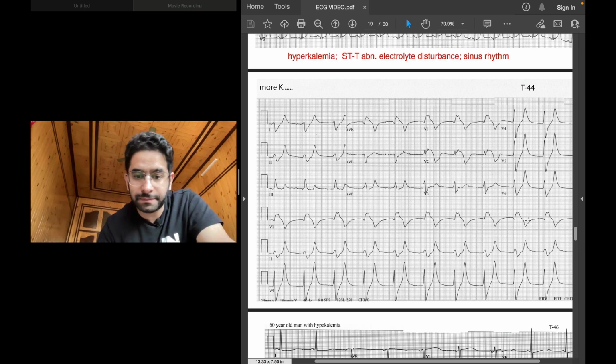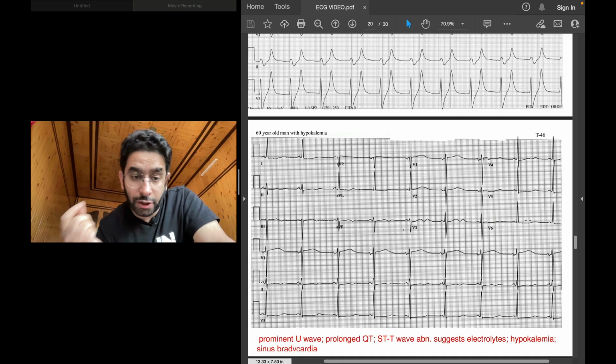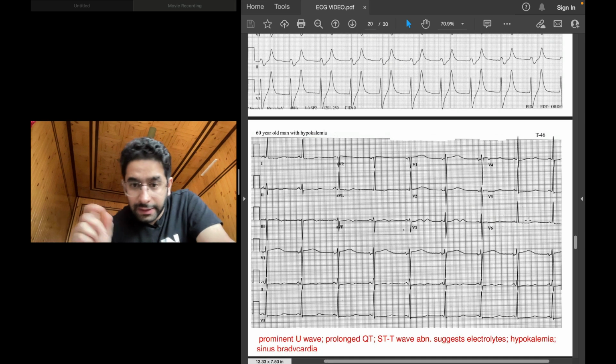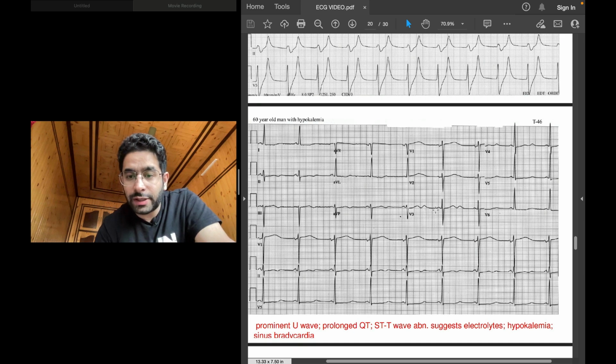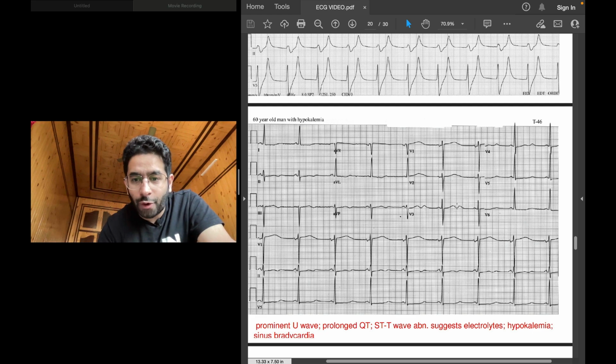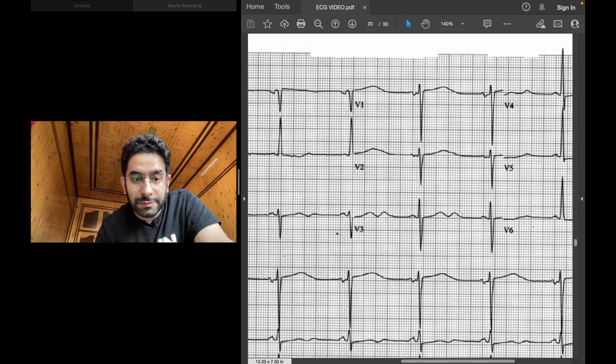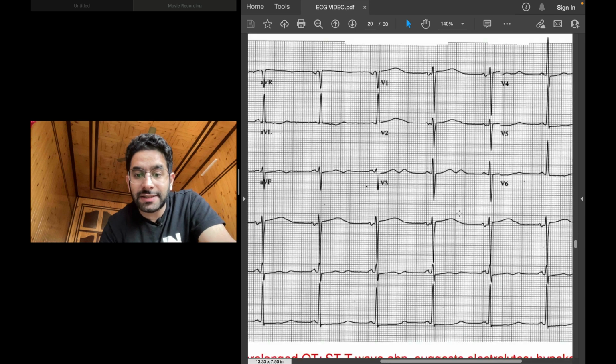And if you treat hyperkalemia, then this patient will live, and then you treat the cause of hyperkalemia. The next ECG is that of hypokalemia. Remember, hyper and hypo are both life-threatening, and in hypokalemia, you get the opposite change. You don't get tall T waves, but they are flatter and there are prominent U waves. Look at this lead here. There's P, there's QRS, there's T, and then a U. So a U wave appears in hypokalemia. In addition, the QT interval prolongs.